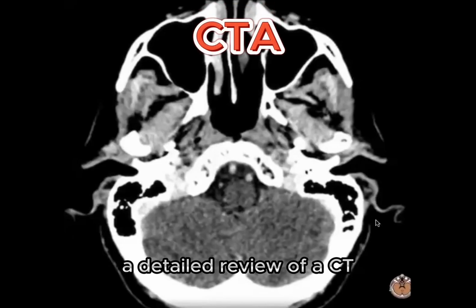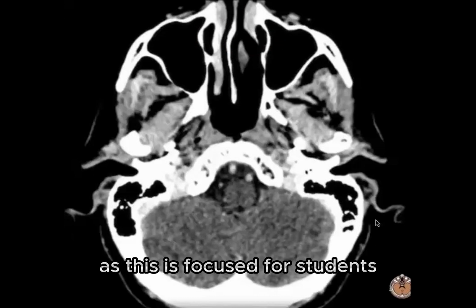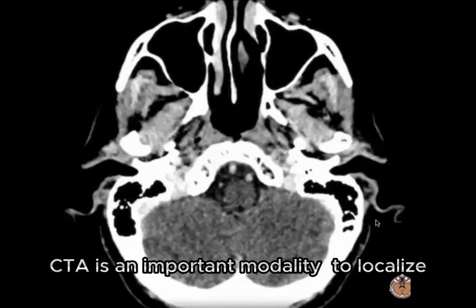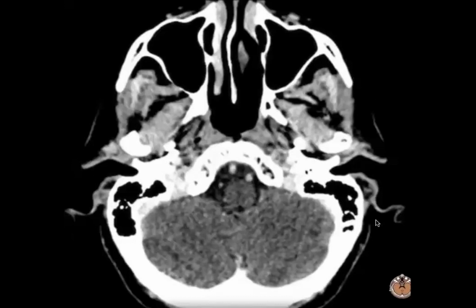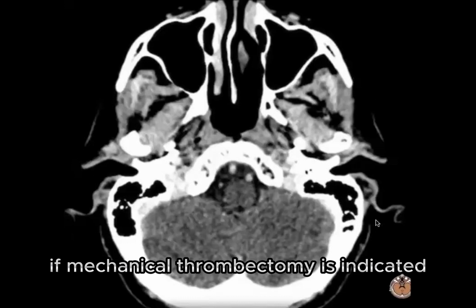A detailed review of a CT angiogram is beyond the scope of this video, as this is focused for students. However, we should take a brief look. CTA is an important modality to localize and confirm vessel occlusion. This study is also helpful to plan for surgery if mechanical thrombectomy is indicated.